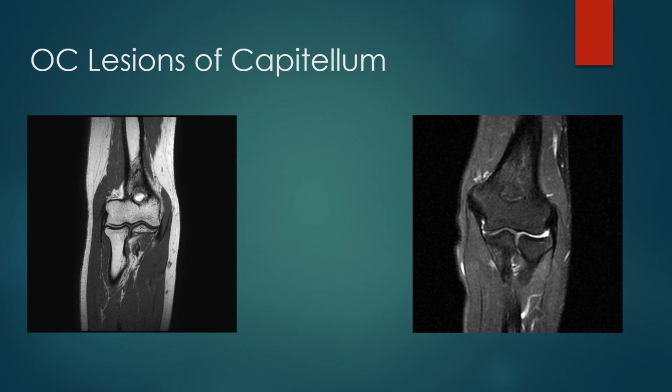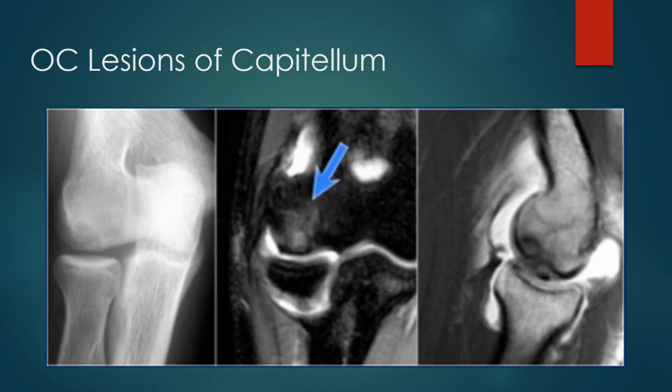These are MRI images of a normal elbow, and in particular a normal image of the capitellum and the radial head. Notice on both of them the smooth edges on both structures without the presence of any effusion, bone marrow edema, or any joint lesions that might be present.